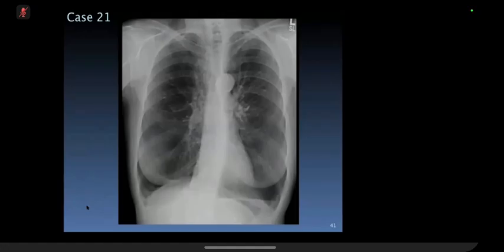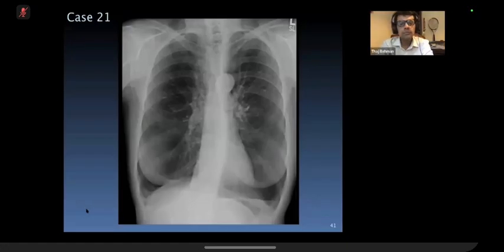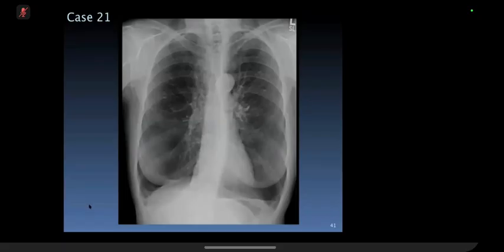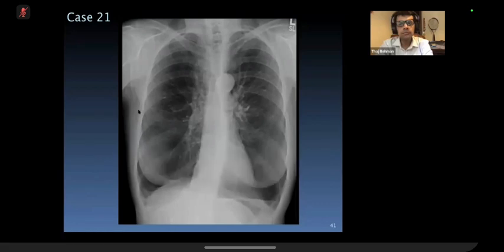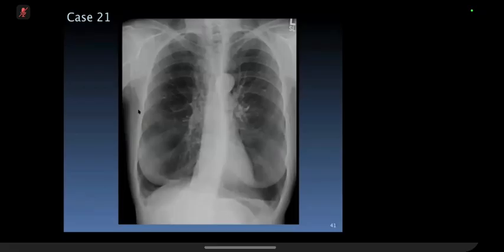In terms of the lung fields itself, I don't see any obvious mass lesions. So the abnormality is probably just hyperexpansion of the lungs bibasally, given that the lung vascular markings are less prominent, I wonder if there's some lower zone emphysematous changes.